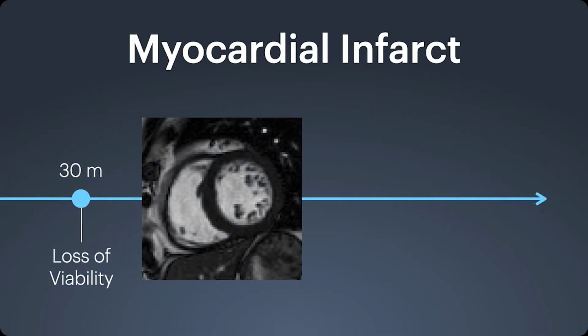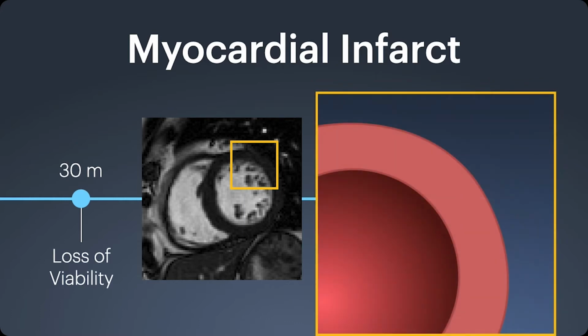Along that spectrum, ischemia begins in the subendocardial layer. That's the layer closest to the chamber. So if we mag this up, we can see that with the ischemic insult, the myocardium has reduced perfusion, starting at the subendocardial layer and working its way back to the mesocardium and eventually reaching the subepicardium.